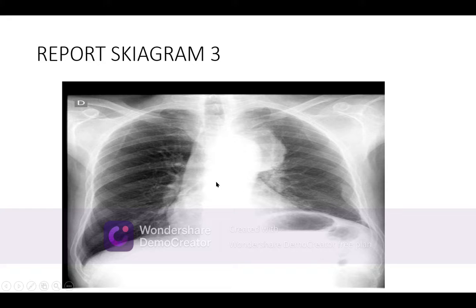The upper part of the middle mediastinum is divided into four, arbitrarily for learning purposes. First part denotes the ascending aorta, the second and third the arch of aorta, aortic knuckle, and the fourth part is here, and this is the pulmonary conus. It is normal. It means that we cannot comment on it.